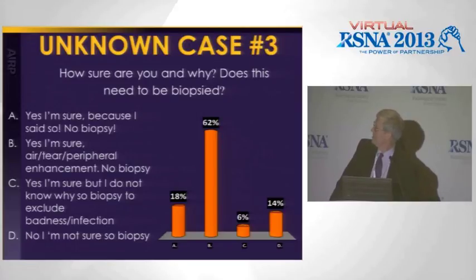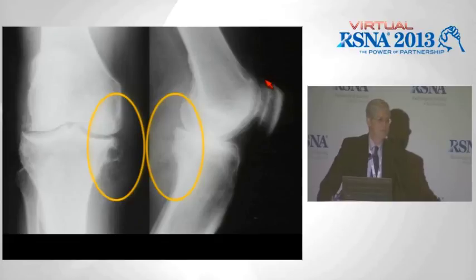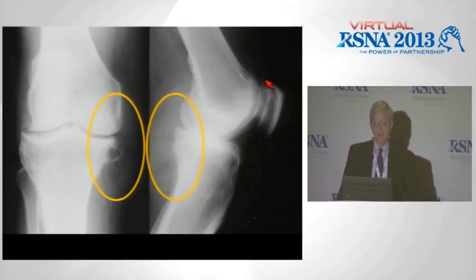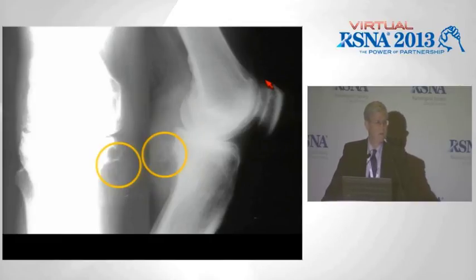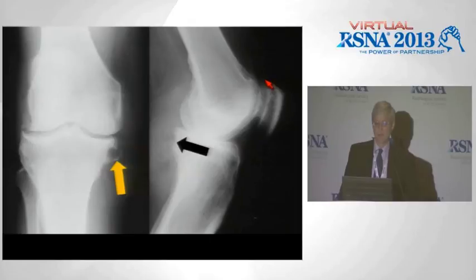All right. Great. Well, that's the right answer. That's what we said, in fact, as well. This may be one of the biggest, if not the biggest, meniscal cysts I've ever seen at the knee. What we can see is the irregularity of the osseous surface, and there are multiple lucencies there. What are those lucencies? They're very lucent, right? In fact, they look like air or gas, which might make you think about infection, other than the fact the bone response looks like it has been there for a while, and that's actually nitrogen that's leaked out because of vacuum phenomena, showing us we have communication with the joint as well.